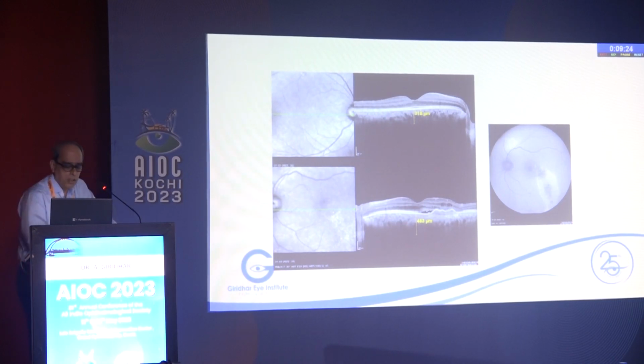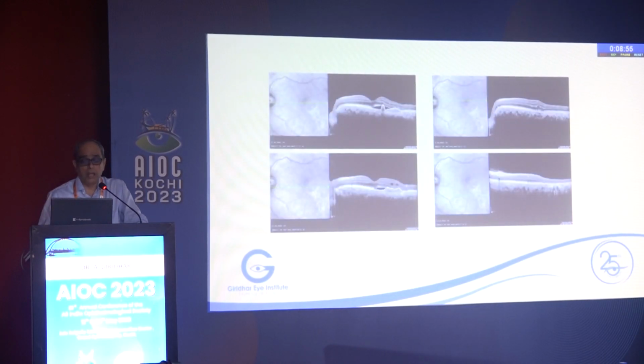Now OCT. In OCT, what is your diagnosis? You can see here OCT passing through that serous macular detachment. So in the OCT also CSR. Looks like CSR or something else. So pachychoroid, yeah, he's got a little pachychoroid, and you see a little bit of an elevation of the retinal pigment epithelium, what we call a FIPED or double layered sign, whatever you want to call it, and that area is a little hypertrophic. Now I'm taking multiple sections.